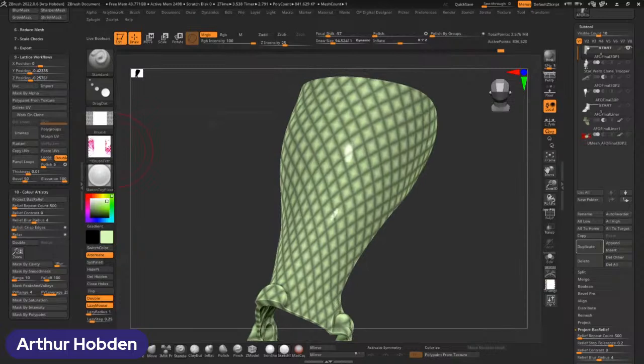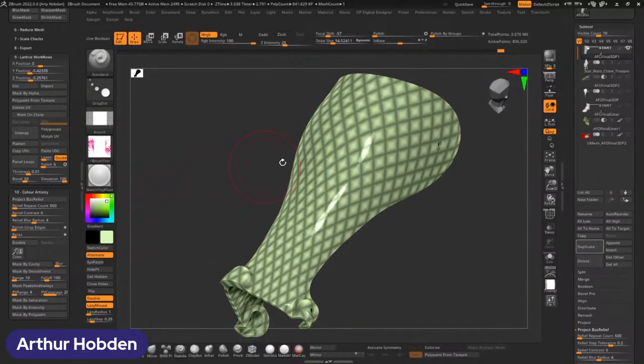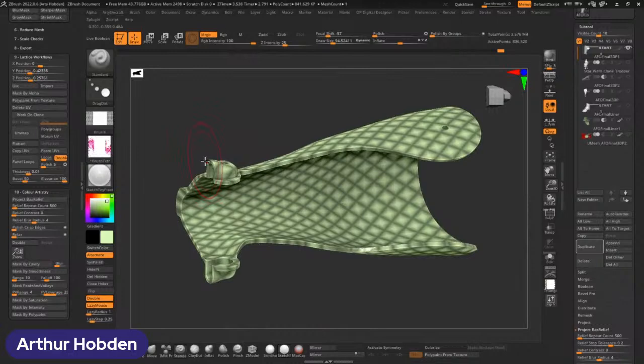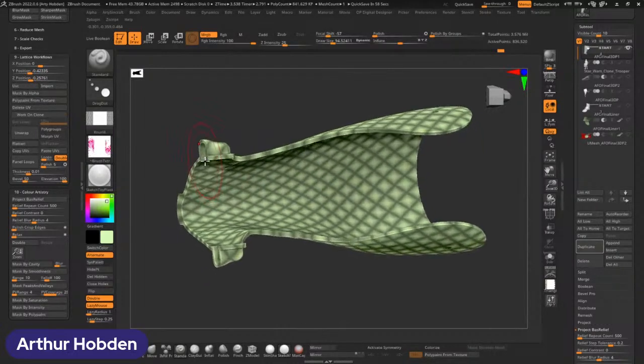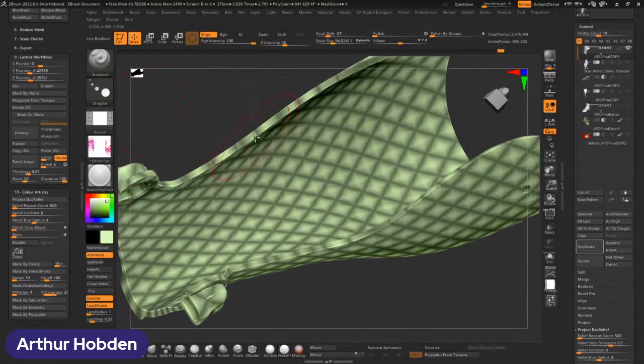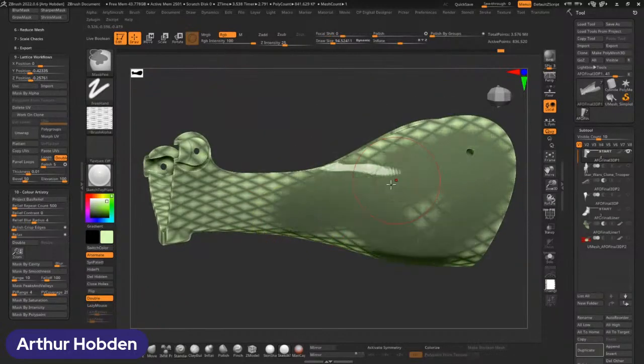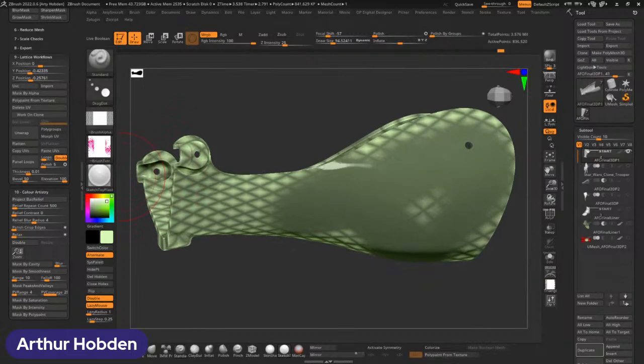Shuj is asking about the trim line and how we can make the trim line. That was in our last webinar. Shuj, if you're interested, I would go watch the first episode. We actually go over that start to finish on how to do trim lines, because we start with a 3D scan, and then you use these exact same tools to drag out a trim line and draw it out. So I definitely recommend checking that out.